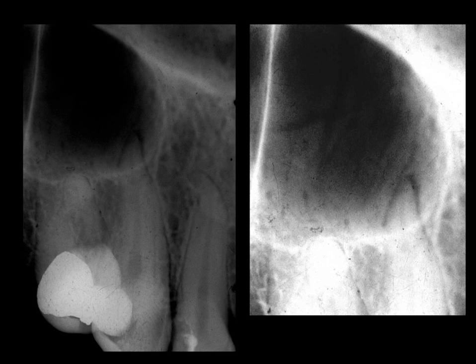You will only see this in anatomical cavities. You do not see it in cysts, and this is a good way of differentiating between pathology and anatomy in this case. Incidentally, if you're wondering what this vertical radiopaque line is, this is a ridge in the wall of the maxillary sinus, which we call a septum, and we'll see more of those shortly.